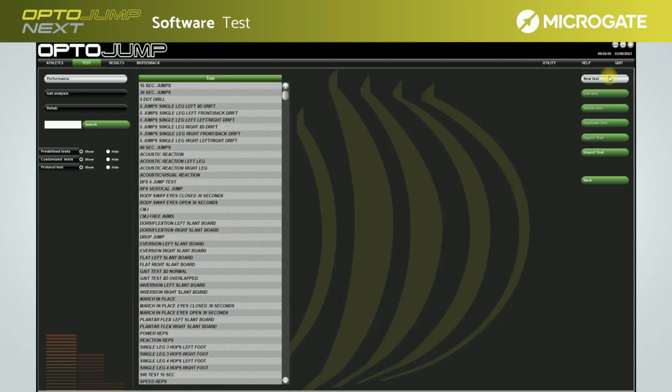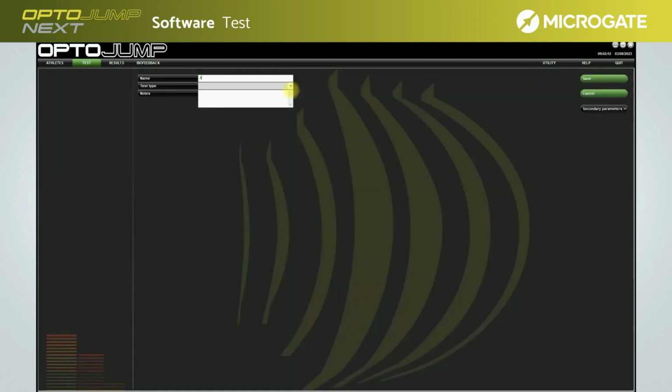After entering the name, you are asked which type of test the system should refer to, in this case, jump test. For each type of test, the start and stop type must be selected. For each selection, subsections will open, allowing you to better create the test you wish to define. Further details will be provided in the following videos on specific tests and their execution.